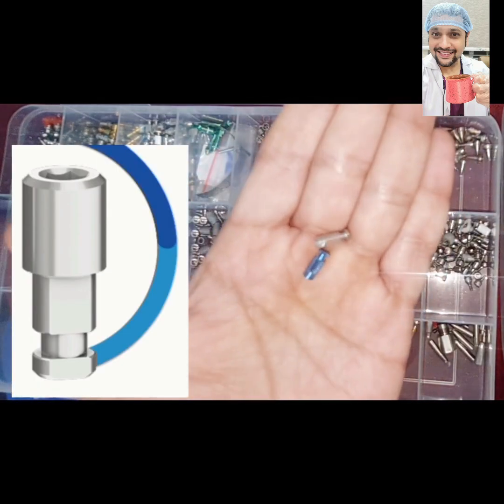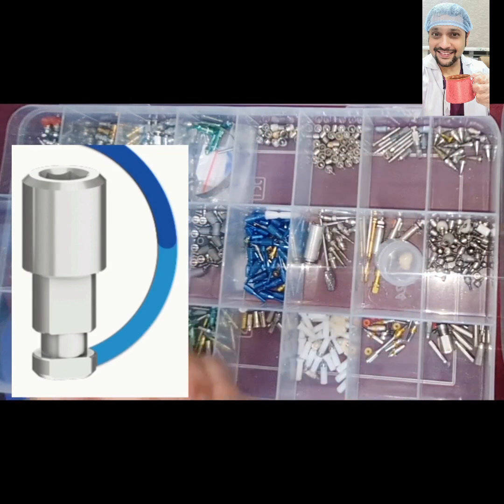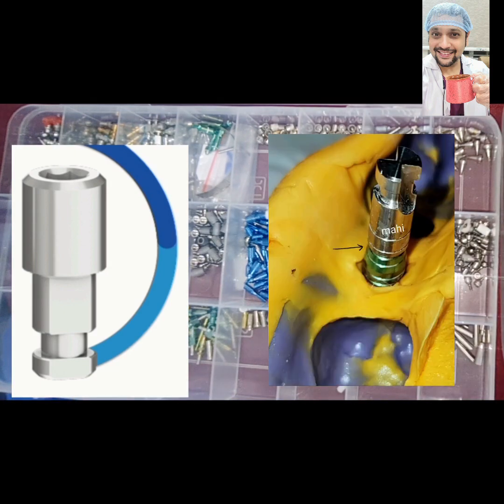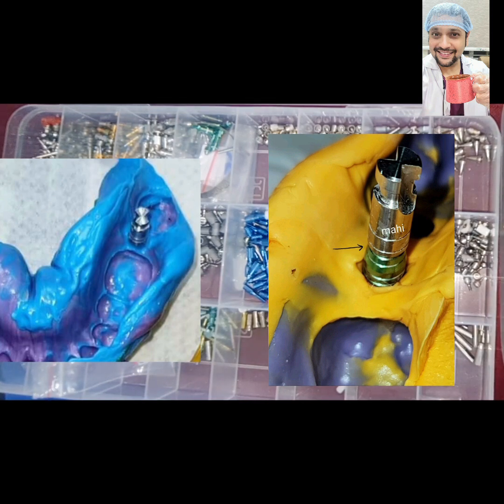This is known as analog. You have two colors here. One is for the physical analog, for the open tray impression, where you can attach this analog to the impression coping and you can pour the impression with the die stone or the dental stone.